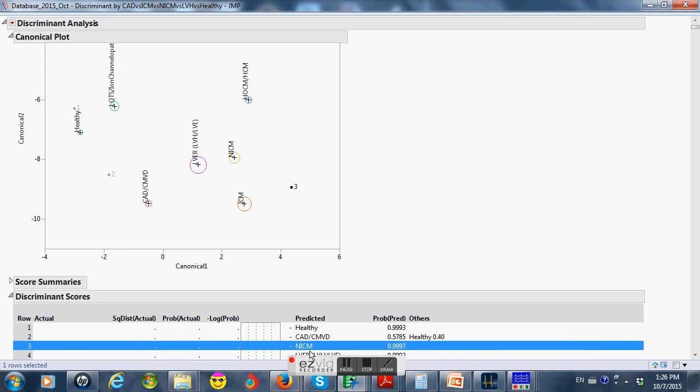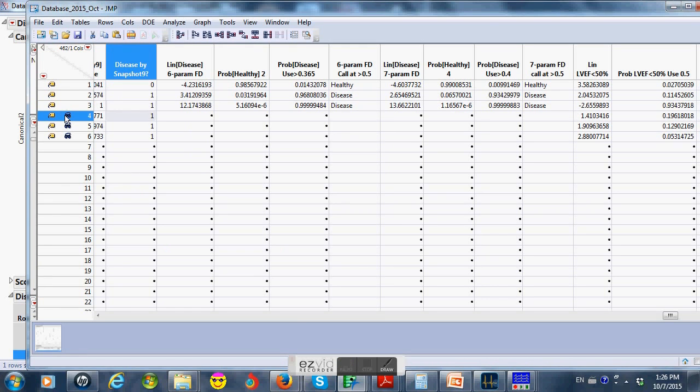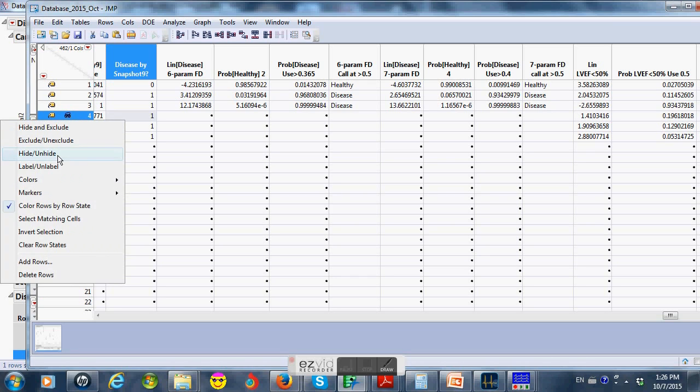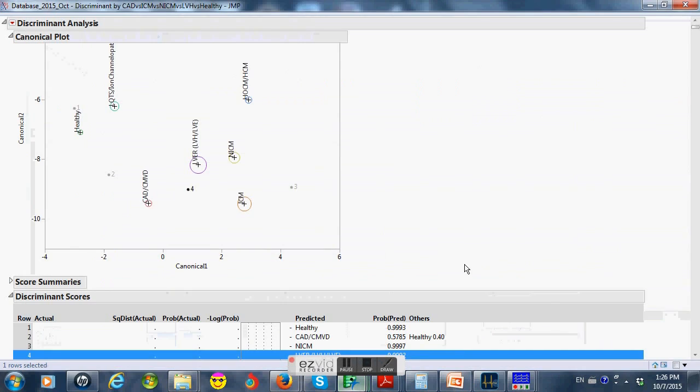It's actually the non-ischemic cardiomyopathy territory if we refer to the call by the database itself. So orbiting that particular planet out in the outer solar system, about as far out as we can get. But again, only a non-specifically abnormal conventional ECG. Let's go to number 4. Remember, number 3 also had the positive LVSD score, so that goes along with the discriminant call as well.